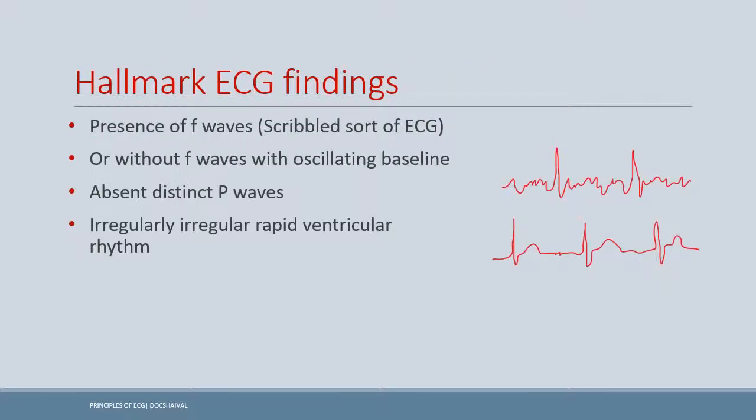So now we are ready to understand the hallmark findings of the ECG. Basically, there is the presence of F waves, as I've already stated, because of multiple wavelets of contraction.